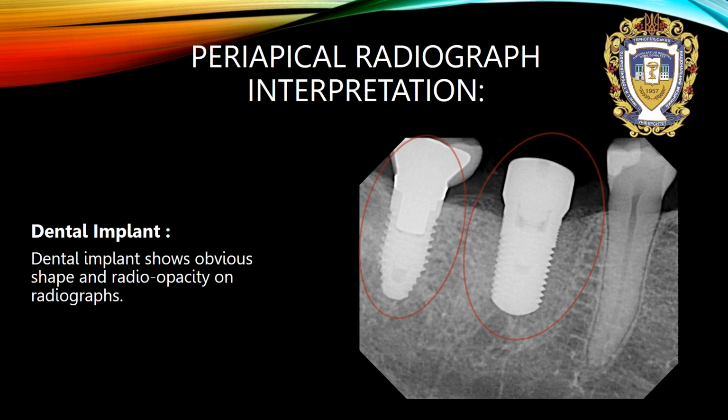Dental implant. What do we need to evaluate in case of a dental implant? A dental implant shows an obvious shape and radio opacity on radiographs.